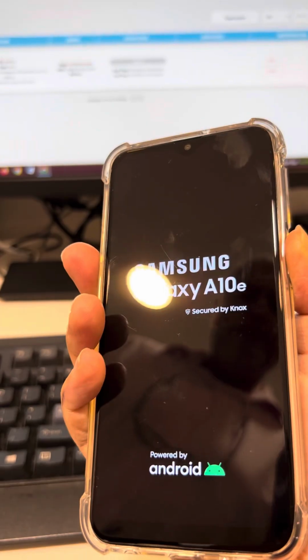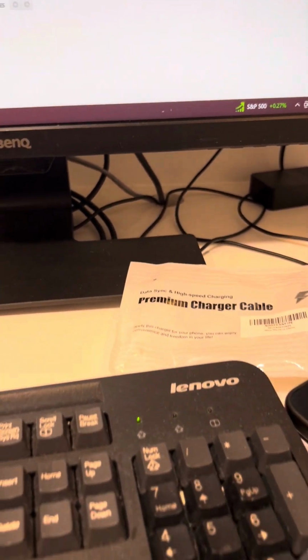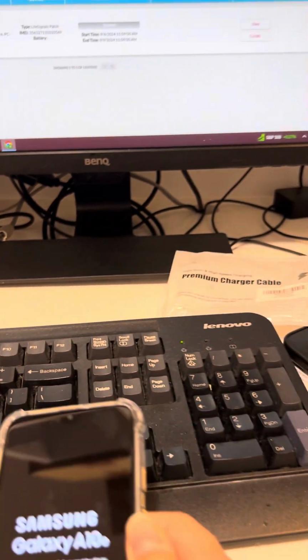There you go. Just let it go. Perfect. You can let go now. Let go. Yep, it's turning on. Just give it a couple minutes.